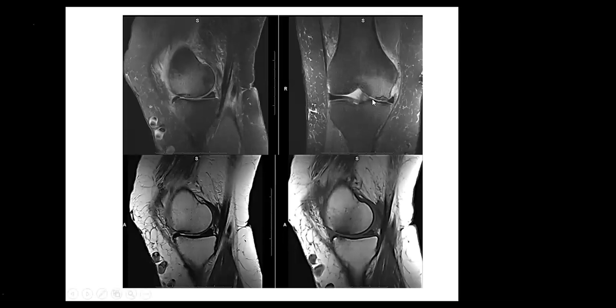You did well on the MRI as well. You described the pathology. There is a subarticular hypointense line surrounded by edema on the weight-bearing surface of the medial femoral condyle. You called it subchondral, but then you said osteochondritis dissecans. These are two different entities. Osteochondritis dissecans is avascular necrosis of the osteochondral part of the joint.